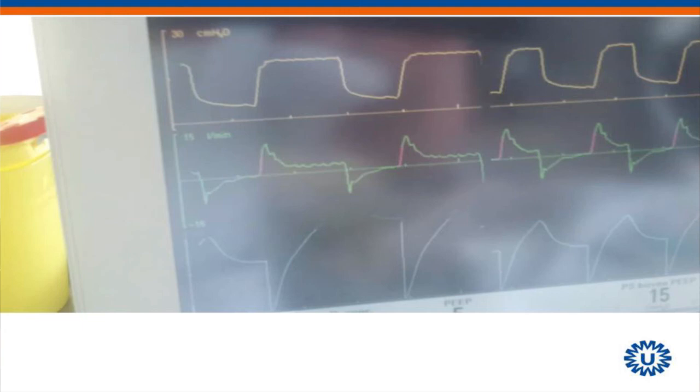I will start them again. What you see is that there's an enormous leakage. You're on a pressure support. And you see here an enormous long inspiration. It's the cycle off time. It's the cycle off. Yeah?